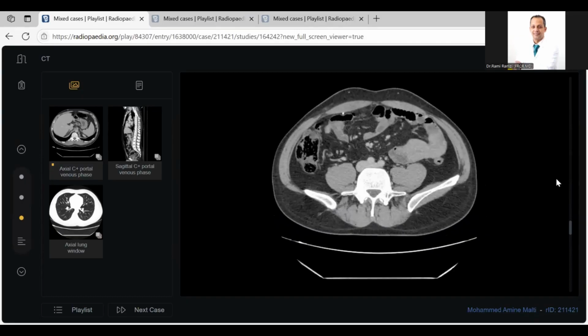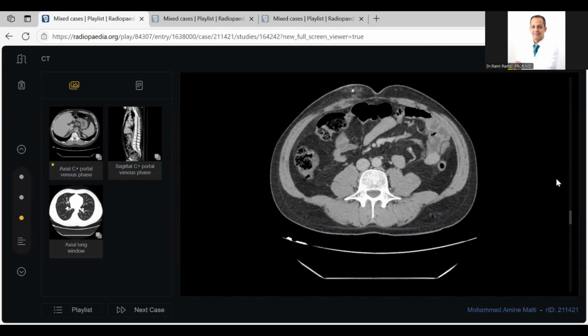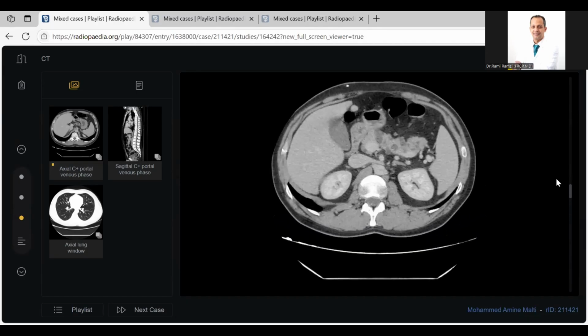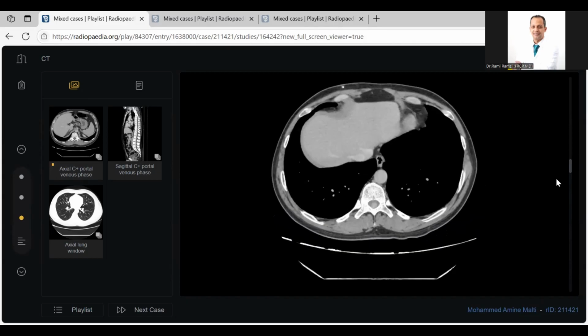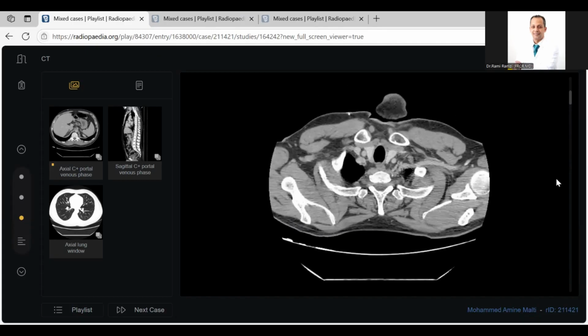So I would like to see the neuraxis of the patient, and there is also a VP shunt in place here. There doesn't seem to be any collection around the VP shunt, so there doesn't seem to be any intra-abdominal problem with the catheter. I would like to see the brain, cervical spine and the spine of this patient to see any cause of raised intracranial pressure. So can I see the MRI brain?